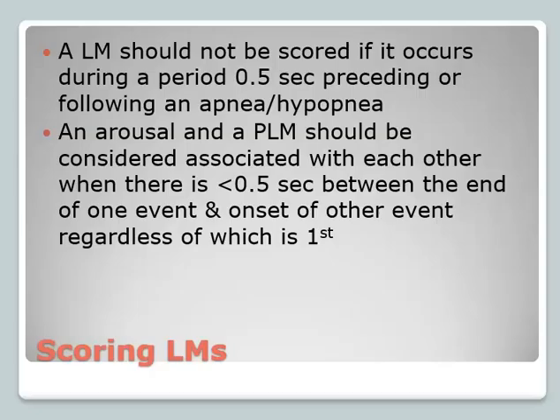When a leg movement and an arousal, an EEG arousal, are occurring within half a second of each other, we can say that they are associated with each other. Either the arousal caused the leg kick or the leg kick caused the arousal.